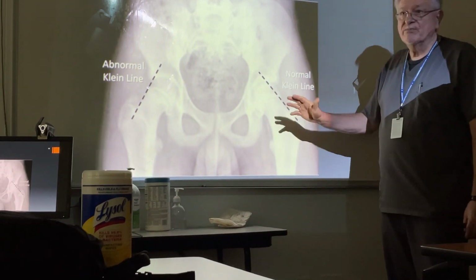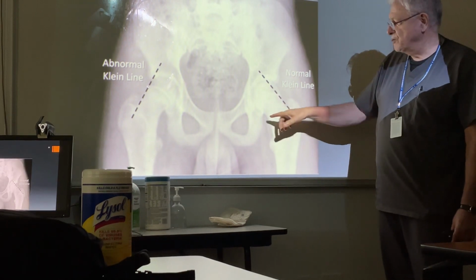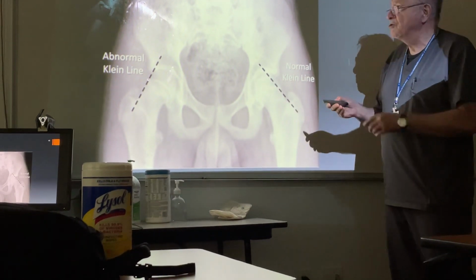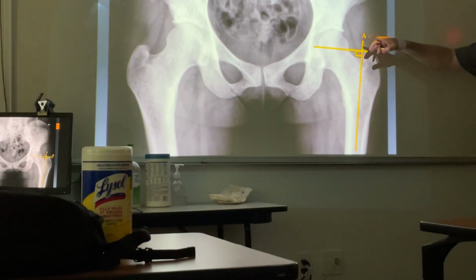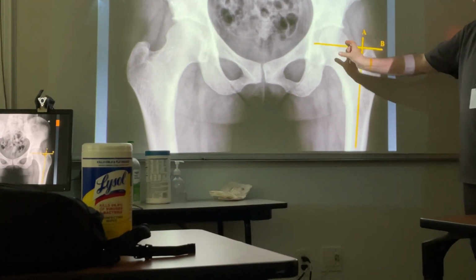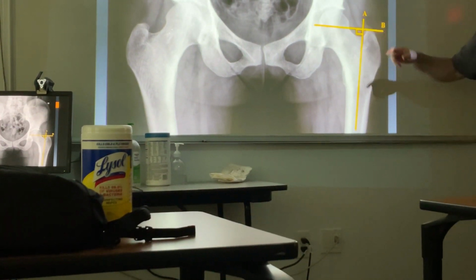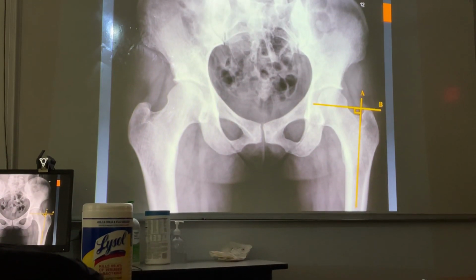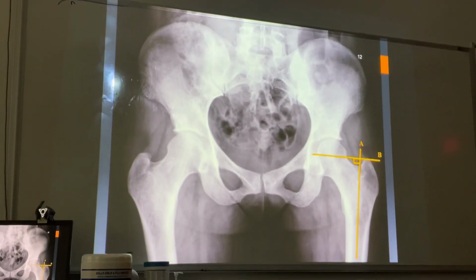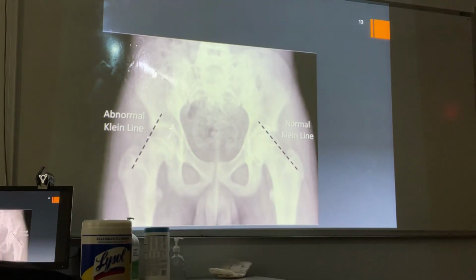Okay, I look at it and I say, okay, a relatively normal relationship. Okay, we don't get into his mild coxa valga. If I had to measure it, I'd have to do the same thing as we just showed you. But I'm not going to spend that time because, yeah, it's a little bit off. Okay, there's no absolutes. And you've heard me say before, we're trying to attach a one-dimensional line to a three-dimensional human object. All right.